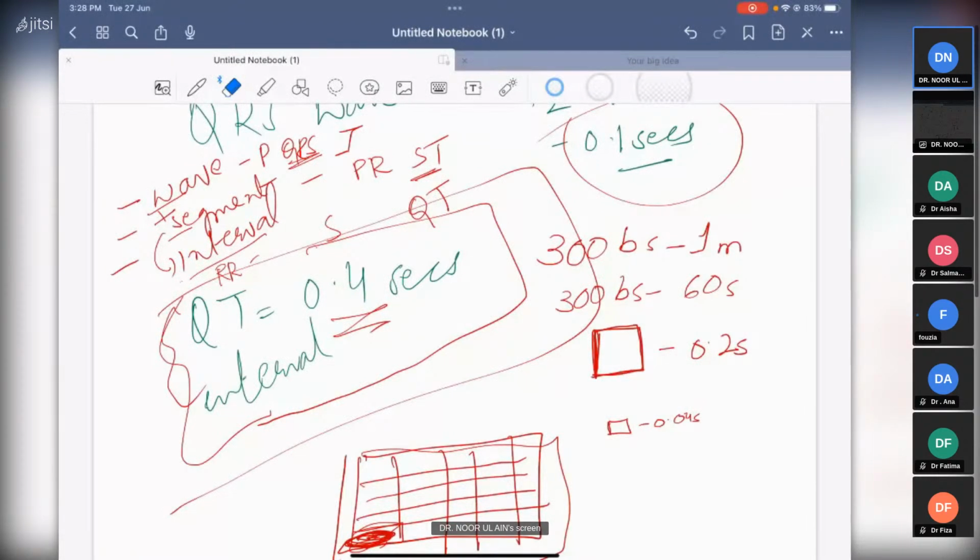Okay. Normally, you wouldn't really see a U wave because it's a part of the QT interval. It is literally the papillary muscles contracting. But sometimes, in some people, yes, you do. It becomes obvious and it's normal. Your papillary muscles are contracting, but it's falling outside the ventricular repolarization, so you might see it. But again, the QT interval would still be 0.4 seconds, which is 10 small boxes.